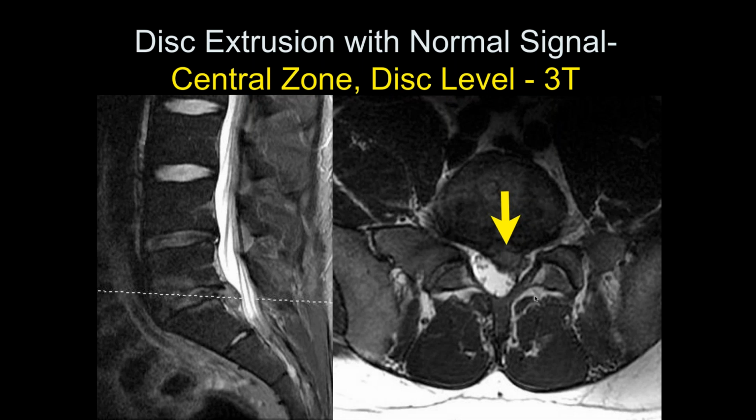Is this going to be L5 or S1 at this level? I think this is the L5 S1 level, the way it's angled. See, this is the level right here, and it's angled back a little bit. So this is L5 and this is S1. No, the nerve root that's displaced. Oh, it's going to be the S1 root. Right, the transiting S1 root. I'm sorry if I said the wrong one. This is the transiting S1 root.